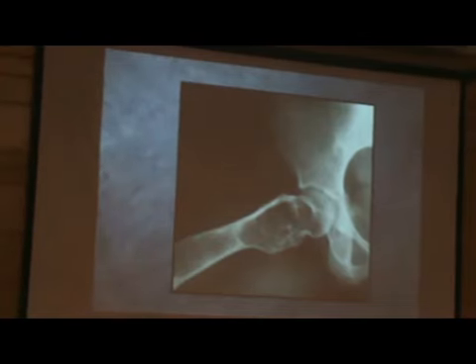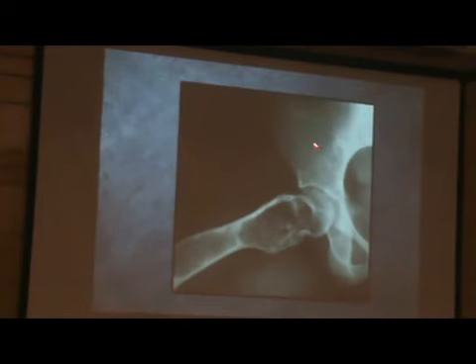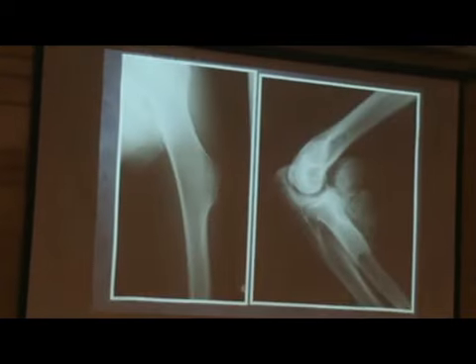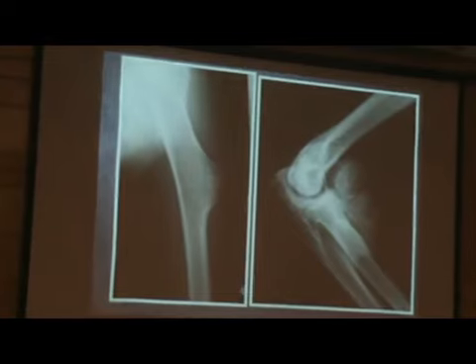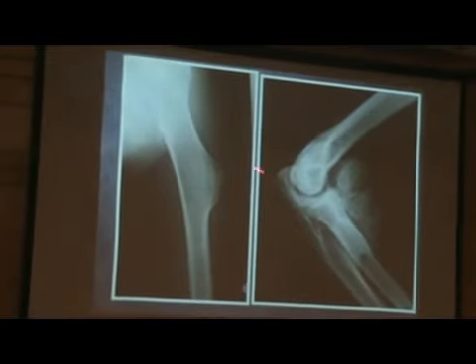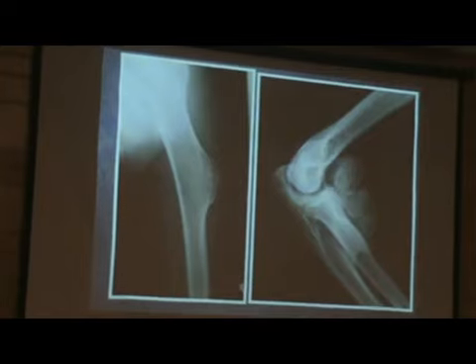When I first saw this case, I was just looking at one big long lesion. And then if you look a little more carefully, there's also a lesion on the pelvis, so this is a patient with multiple fibrous dysplasia lesions. There's another patient with sessile osteochondroma, so this is a patient with multiple osteochondromatosis or hereditary multiple exostoses.